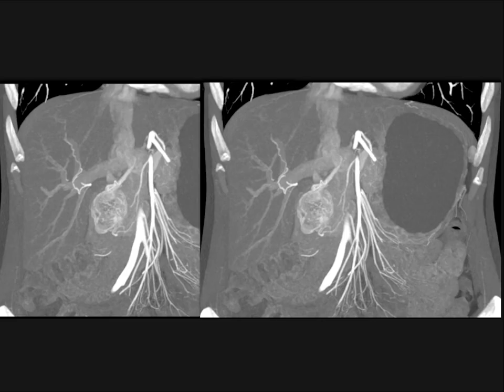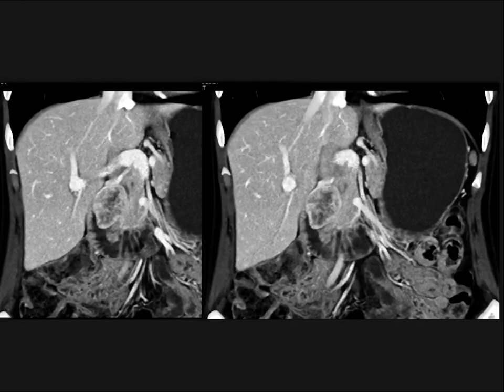Here the lesion is smooth, sharply marginated, but again, could this not be pancreas? And here it is where you see it very nicely off a branch vessel, off the GDA and hepatic artery. But again, it's something you would have considered as a definite possibility. Here it is again, okay? And that was a duodenal GIST tumor. Again, different appearance, vascular, a little bit more necrotic on delayed phase imaging.